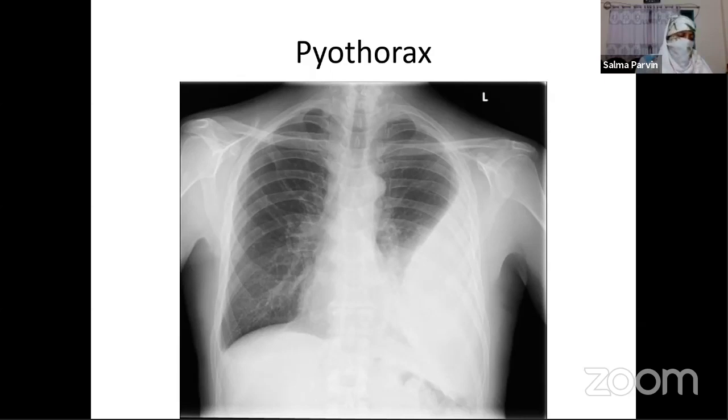Thus the pyothorax is seen in the chest X-ray, and we can also be sure in ultrasound.